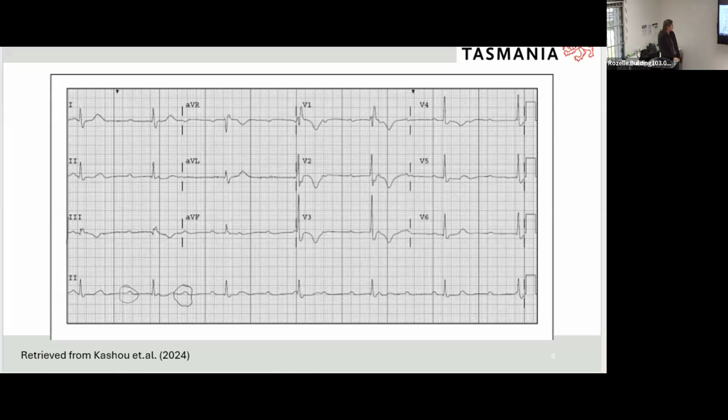Maybe not actually. Would you agree, Anita, or you think that they're the same? No, they're definitely different. Morphology looks quite similar in the sense of what they are, and if you pace them out as well. Yeah. I mean, it's hard because they're in the other complexes as well. Yeah. But if you go along to the end, you can see you've got two clear ones between, you see the last QRS complex. Yeah, these two look probably the best run of them because the next set are going to be buried.